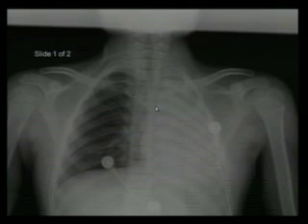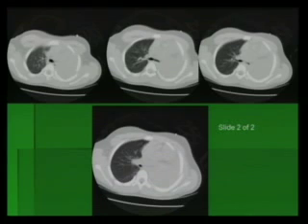Maybe the patient's wheezing and they know that they had something in their mouth. They did a bronchoscopy here. They did a CT first. Didn't need to, but they did. You can see the right main stem, left main stem, and then it just stops. And I think it was an aspirated peanut or cashew. They're non-radiopaque, you can't see it.